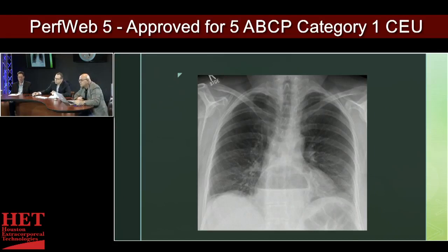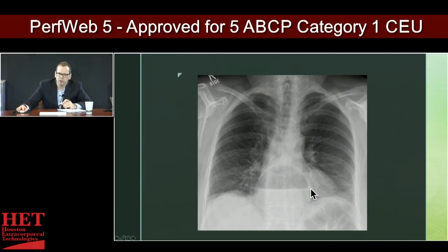If you look at the center of this, you can see that there's an abrupt line here, which on the normal x-ray is not normally there. Right. That doesn't even look anatomical. No, it doesn't. And you also notice, as compared to that normal x-ray, you have what appears to be some air and solid material interface as well. So this is somebody with a large hiatal hernia that has stomach within the chest. The hernia defect is going to be usually central in portion around the esophageal hiatus. The stomach has slipped up into the chest, and this is just an air bubble within the stomach.